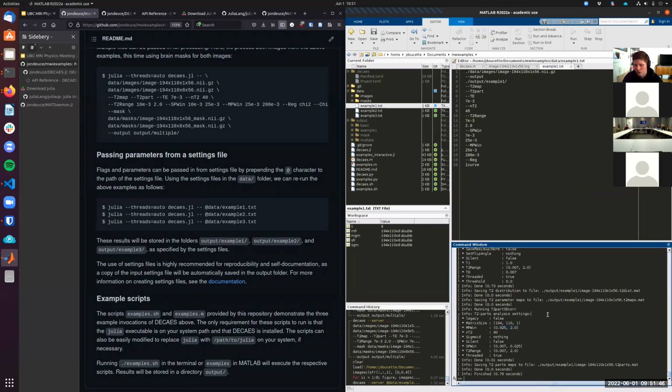And you can actually even do this with multiple settings files. Say I had a settings file that's my default settings, and then maybe my modified settings for this study, with some small modifications. You can chain them together, and whatever's added last will be used last.